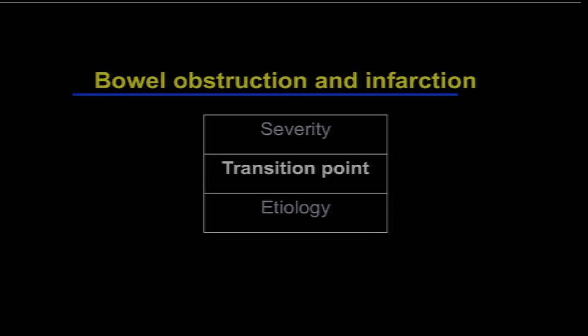Let's move on to the next point. We see we have sick bowel. It's either dilated or looks funny to us. If we see dilated bowel, we need to find a transition point. This is a point of debate.